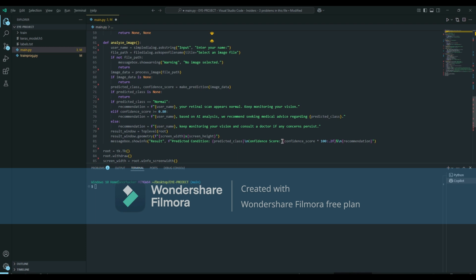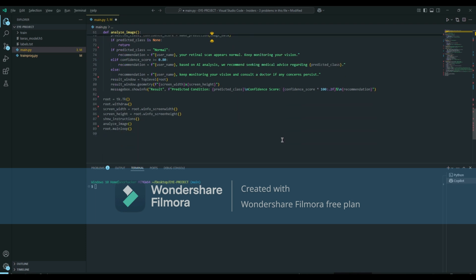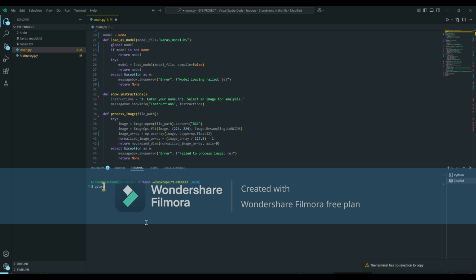Once the image has been uploaded, it runs it through this machine learning model, which has an extremely high accuracy. Once it's run through the model, it generates the label and tells you what it is. So let's go ahead and try to run this now.